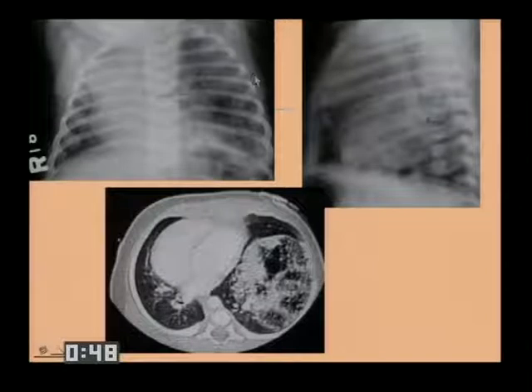Again, a recent case diagnosed prenatally, and in this case the child does have mediastinal shift. We've been following this child now, he's 18 months old, to see if it involutes at all. He's growing well, he's asymptomatic, hasn't really changed size, but if it doesn't grow, it may proportionally become less of his lung.